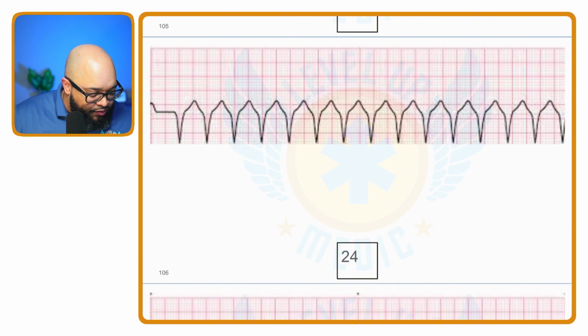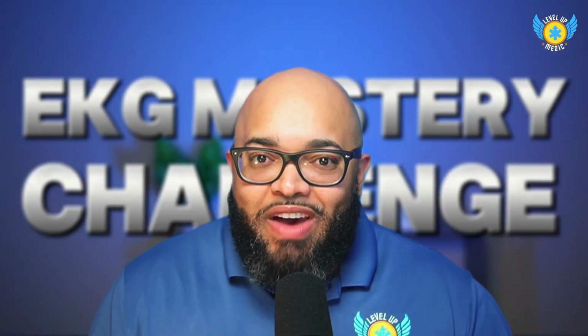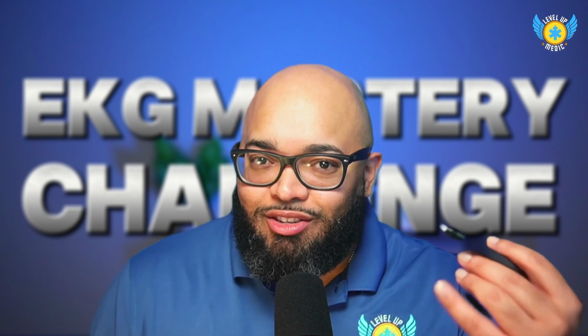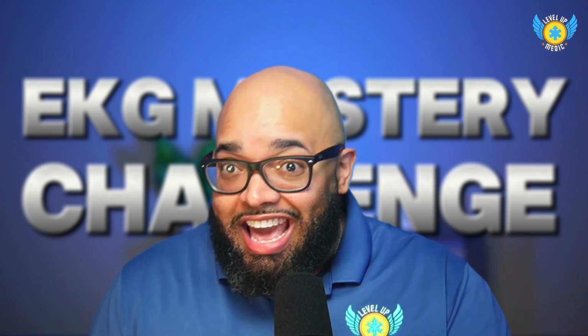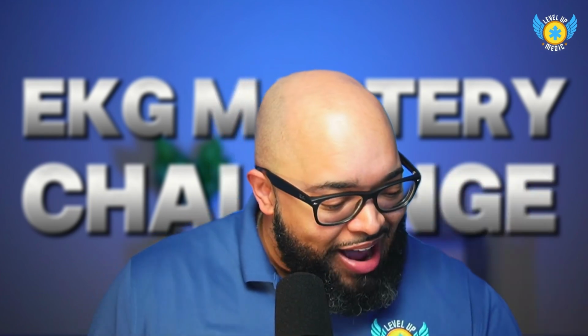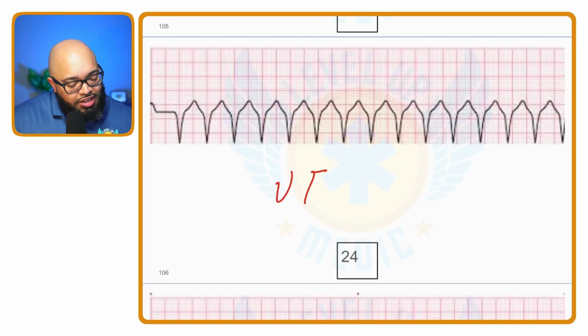Now let's look at this ventricular rate here. It's 300, 150. So it's fast. So it's wide complex and it's fast. So it's tachycardic. The wide complex tells us that it's ventricular and it's tachycardic. That's called VTach. That's right. So we have, for instance, VTach.